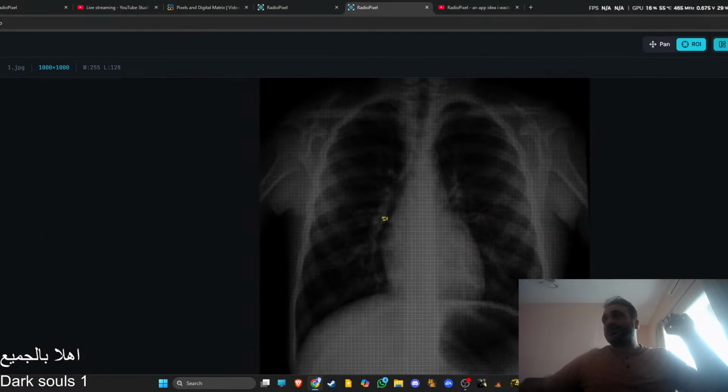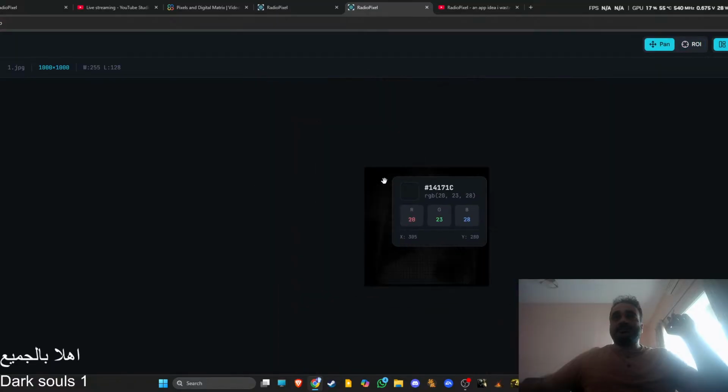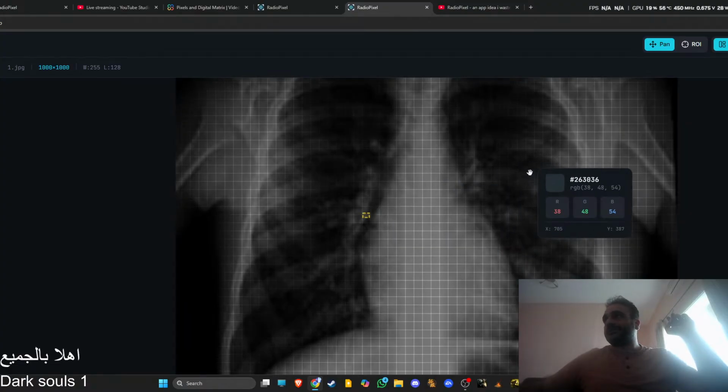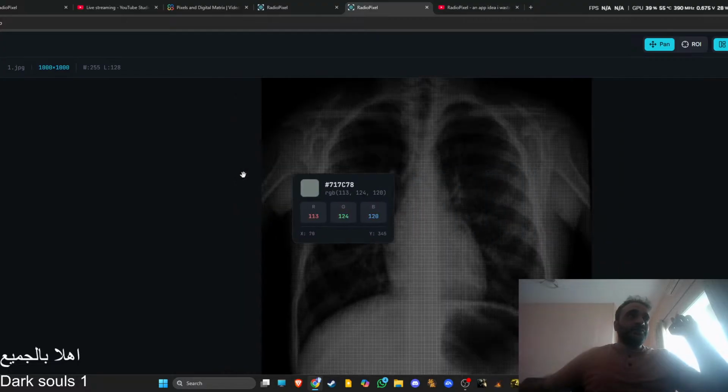Here you can switch the view, single and compare. You can switch to the other view mode, which is not really working. Here you can see, that's why you need to test your stuff. Let's play with the window settings.